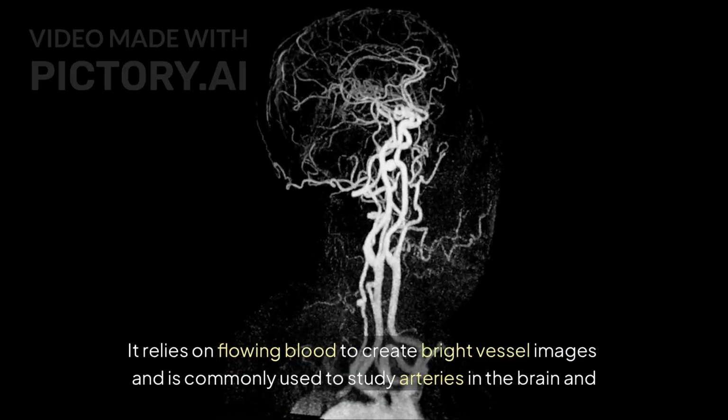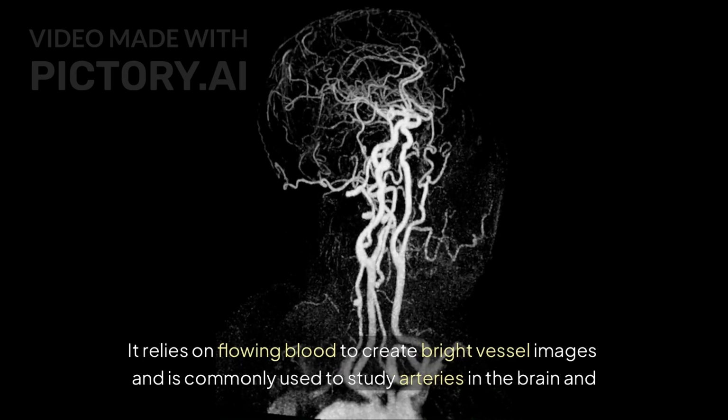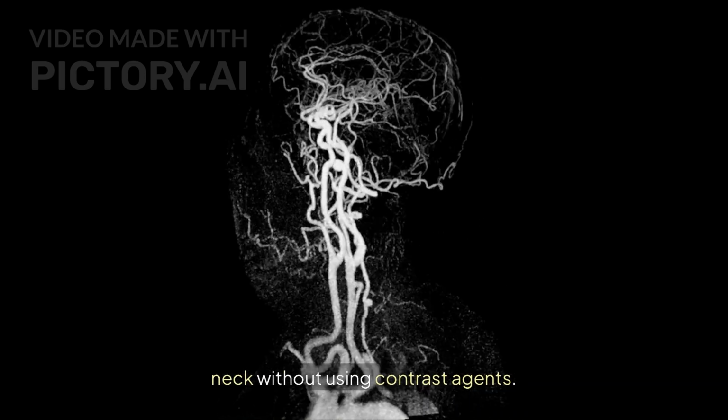Time-of-flight angiography, or TOF, is a non-contrast MRI sequence used to visualize blood vessels. It relies on flowing blood to create bright vessel images and is commonly used to study arteries in the brain and neck without using contrast agents.